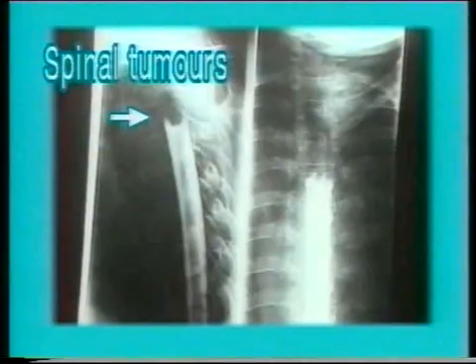This myelogram shows an intradural intramedullary lesion. There is widening of the cord shadow seen within the contrast, and the filling defect is central without widening of the contrast. This is another myelogram showing an intradural spinal tumor with total block. Note the irregular convex edge and the central block.